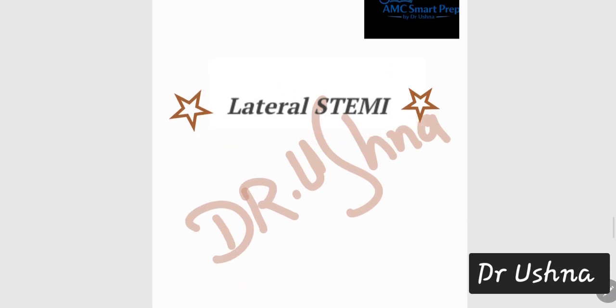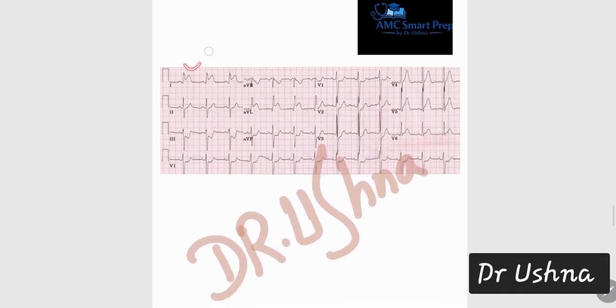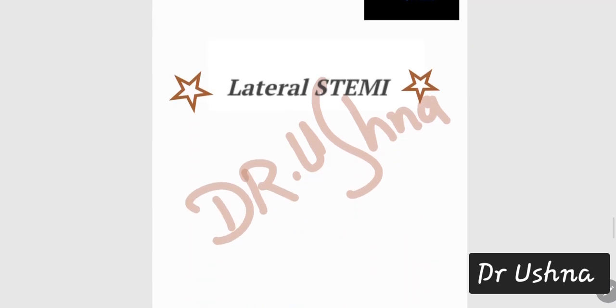Remember, we did lateral STEMI, lateral wall MI, that person with one hand with the 5-6 fingers laterally placed. So this is known as lead 1, AVL, V5, V6. You are going to have a lateral wall MI. So there is ST elevation in AVL, and just a little elevation in V5, V6, not very pronounced, but you will be able to see in lead 1 and AVL straightforwardly that you are dealing with an ST elevation MI, lateral ST elevation MI.